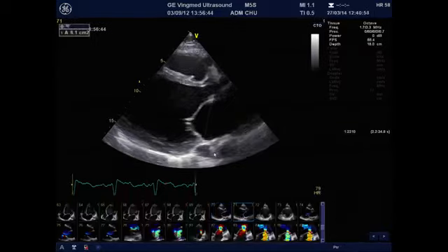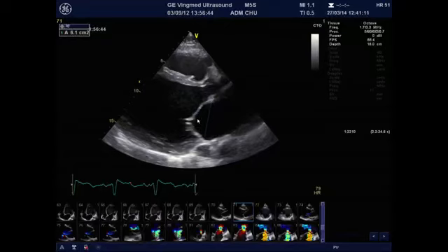Here you have a systolic tenting area of 6 centimeters squared, highlighting the severity of the deformation of the mitral valve. The normal value should be less than 2, and in these patients, if we have more than 2 or 3, this is associated with a high likelihood of recurrent mitral regurgitation after any kind of valve repair.